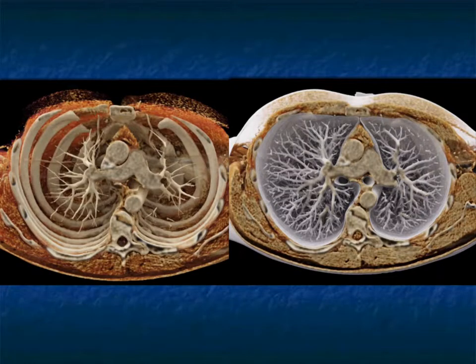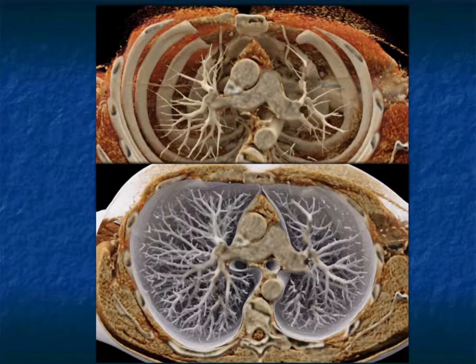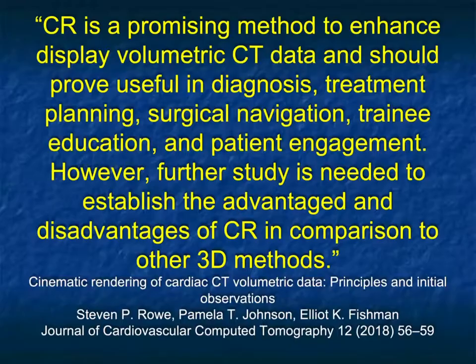Here it is, a view from below, right? On one image, I'm showing you without the lung parenchyma. On the image on your right, I'm accentuating the parenchyma and the pulmonary vascularity. So you can see it's the same data set, the same volume. It's simply me choosing what I want to show. Look at the borders of the lung, and there's the thymus sitting there, and here it's sitting here as well. But again, the detail and information will vary depending on how you do the information.